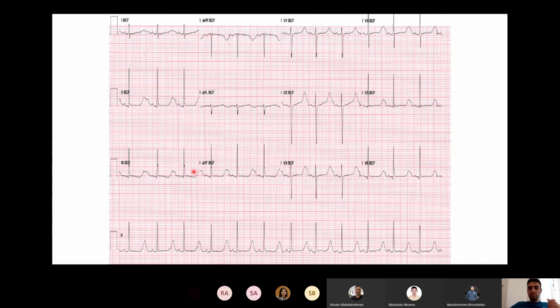So this is an example. This is one of our patients who had frequent syncope at home, and this is his ECG. He has super long QT, and if you measure it, it's around 600. Okay, this is super long QT. This is a very dangerous finding, and this patient is lucky to survive his frequent syncope. He probably had non-sustained VF, or torsades.